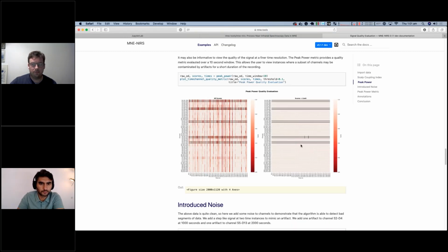And of course, there's the more standard tools like coefficient of variation. Yeah, and if you're doing a waveform analysis, you can just reject on peak-to-peak threshold, so you can say anything with a peak-to-peak value greater than this, just exclude. So those sorts of things are in there.